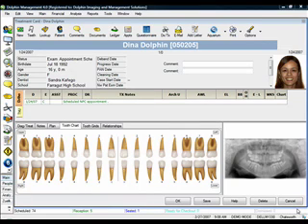Hello, I'm Todd Blankenbeckler, Manager of Development of our Dolphin Management product, and I'm going to do a short introduction to our new tooth chart, which will be integrated into Treatment Card, and it's going to be released in version 4.0, which we're targeting for September of 2008.